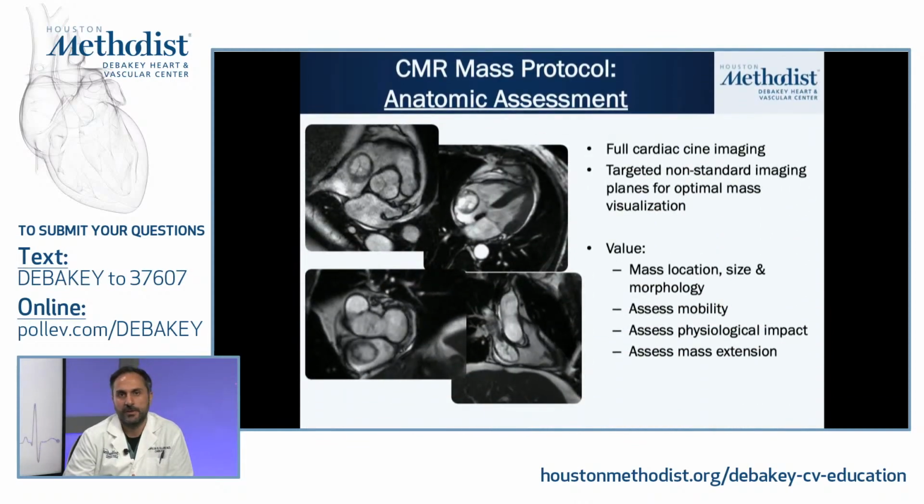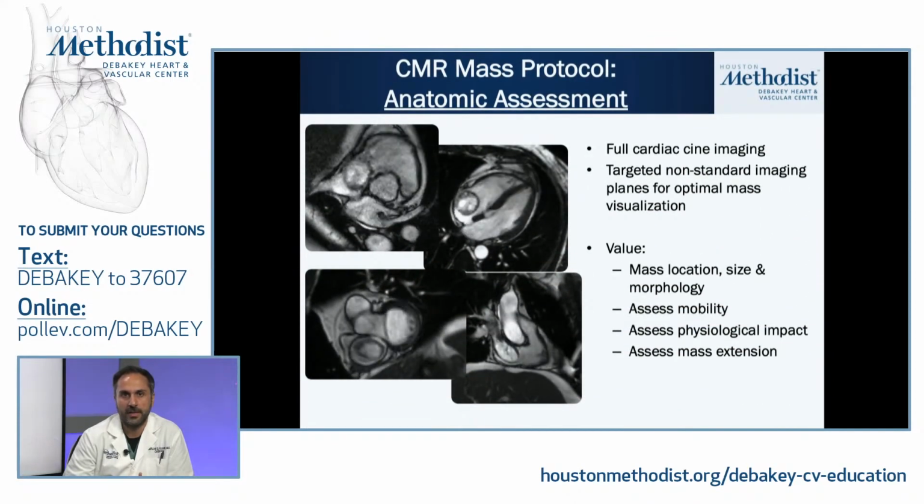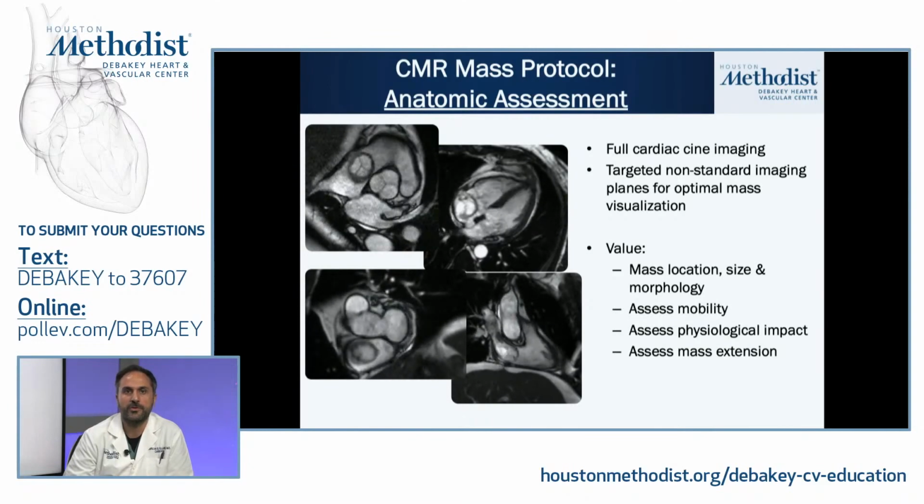So for the anatomic assessment, as I said, these are a set of images showing how we can look at the mass in different views and assess it in different ways.